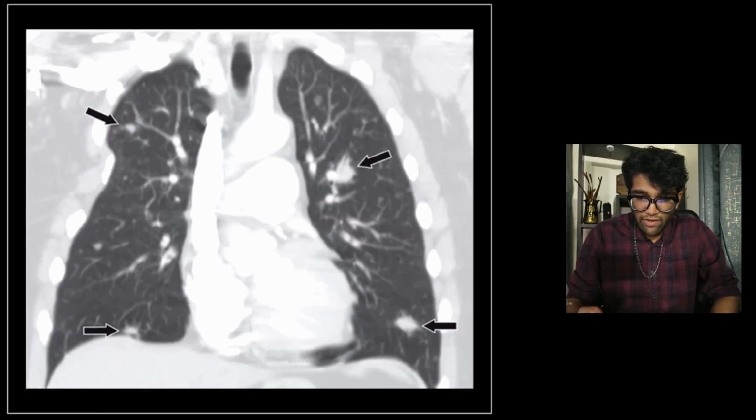What about a nodule? So a nodule is a very well defined opacity, which either has very sharply demarcated borders, or produces a positive pressure, or pushes things away from each other. Sometimes a nodule or a mass or a consolidation can be confused with each other, but usually the sharp demarcation is what delineates the two.